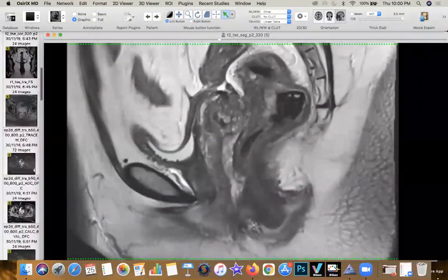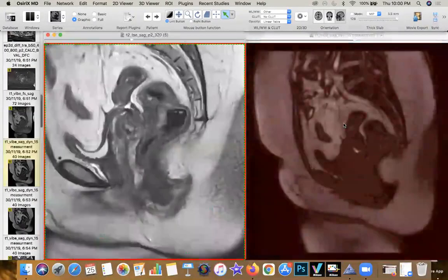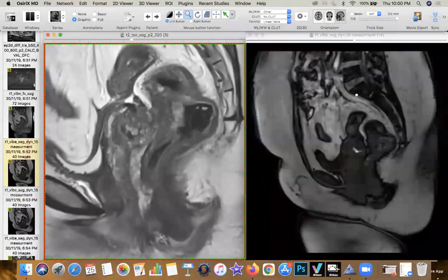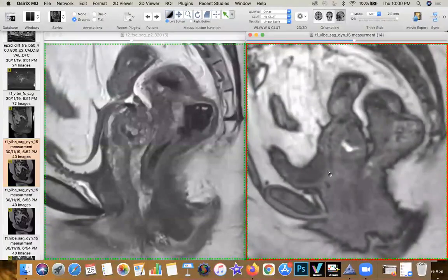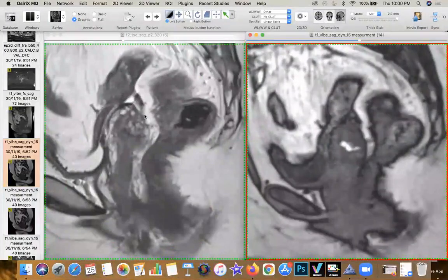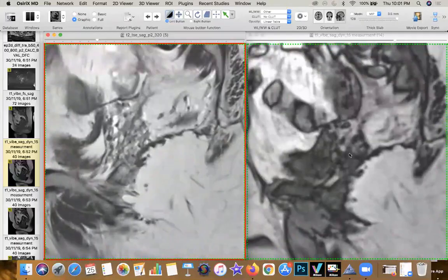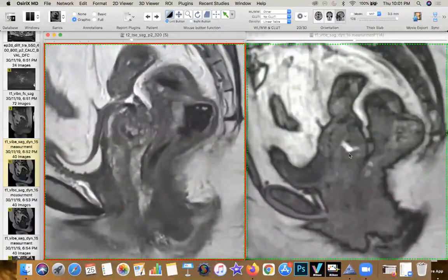So here we have a patient who has come with the classic appearance of a recurrent disease, which is seen at the level of the vaginal vault. So I'm going to magnify that image on the T1 weighted 3D fat suppressed gradient echo sequence. And you can see this kind of ball-like structure sitting up in the vault. You can see how the vault is retro-tipped. It's pulled back again. And within this ball-like structure, you can see this internal variegation with some amount of T2 shading where the T1 brightness is seen. And this is again a vaginal vault recurrence of endometriotic tissue.